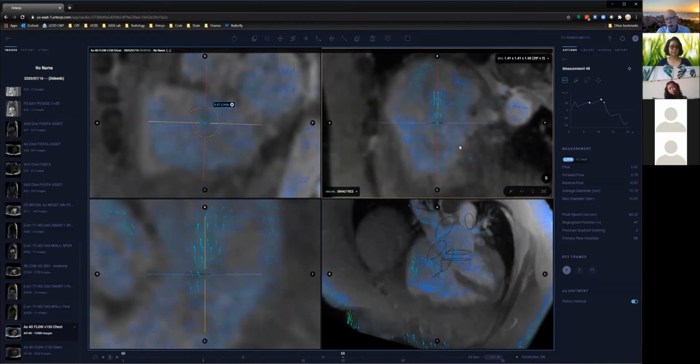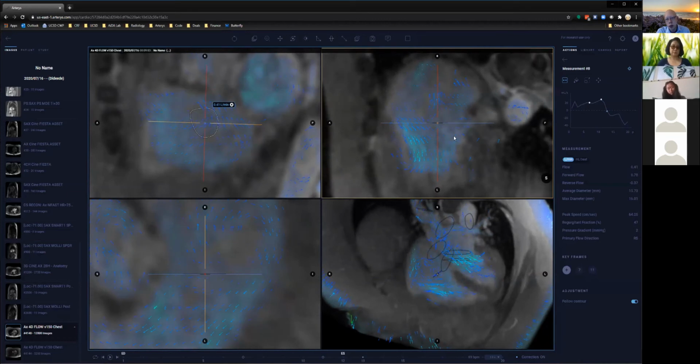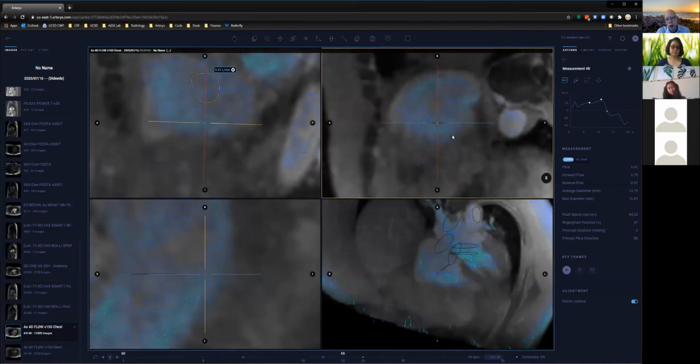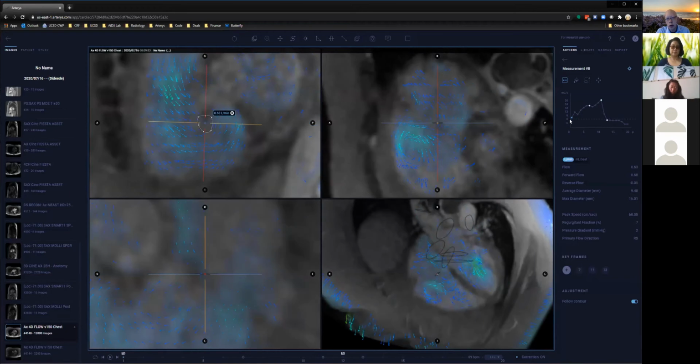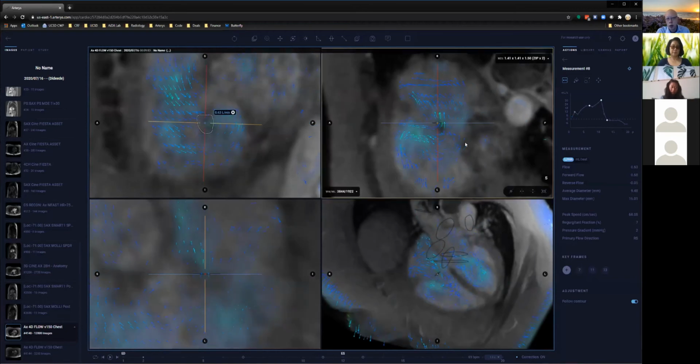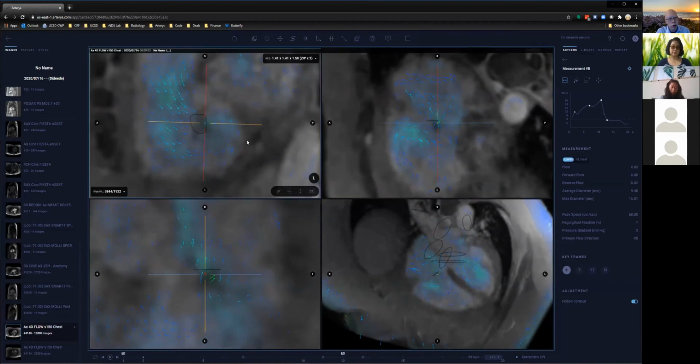And so this is probably the last phase that we have regurgitation. Maybe there's a little bit more after this. It's sort of temporally averaging the regurgitant jet with the diastolic inflow. I'm just going to shrink this segmentation to 0. So there's probably very little flow there. Just walk over to early systole and maybe move forward a little bit more. Here we go. So I see the jet again.